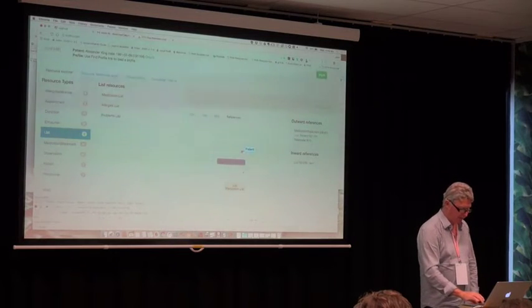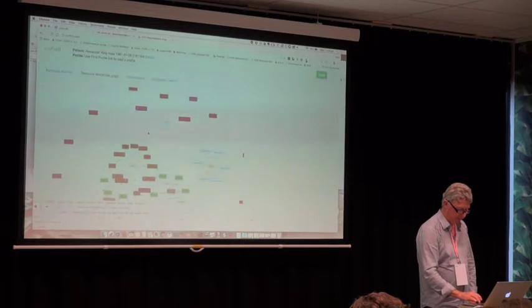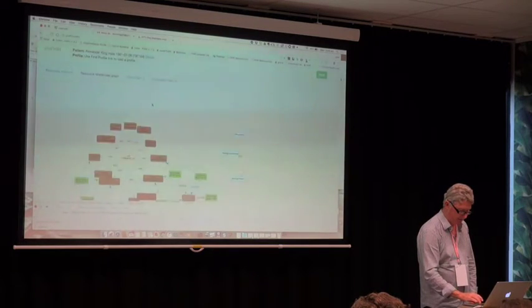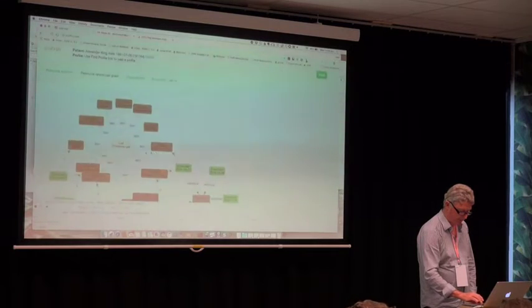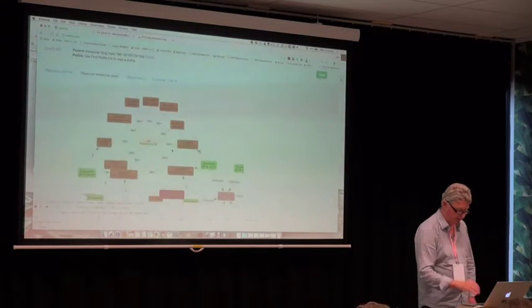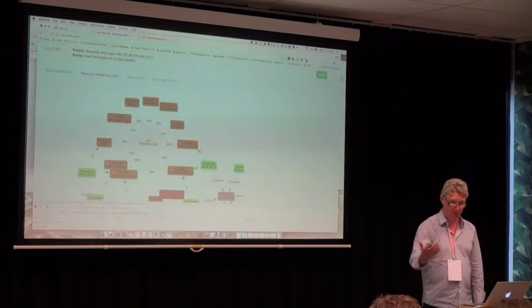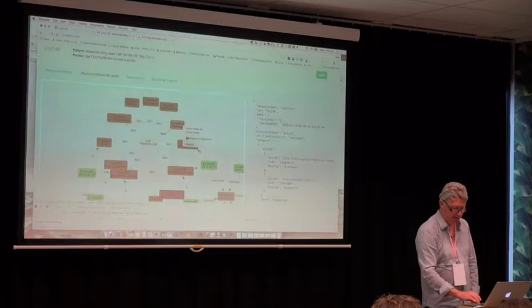We've got a number of other ways we can look at it. This tab here shows all the resources on file for this patient. So again, here is, you can zoom it and move it around and do that kind of stuff as well. So that's showing the problem list resource. And again, showing references to condition resources in this case. And again, I can select them and have a look at the details in here.